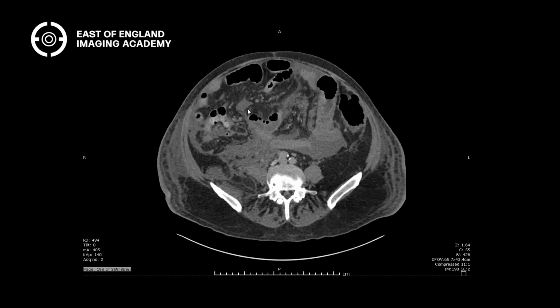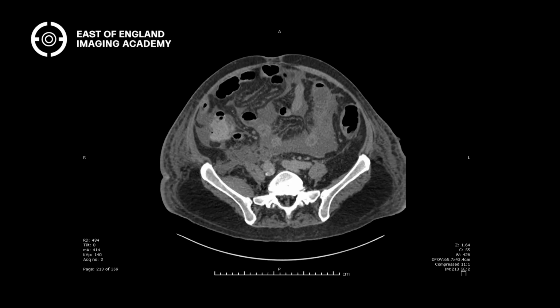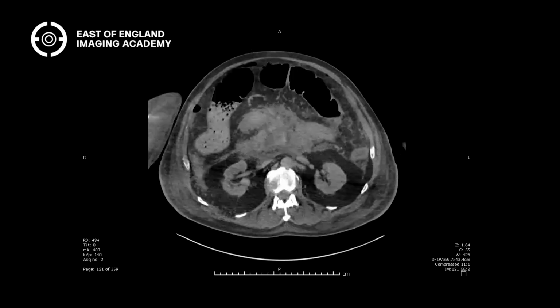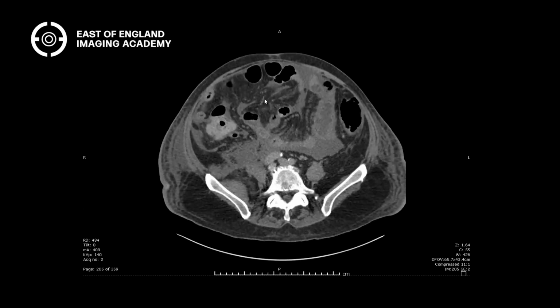It's just fluid that's not in your intravascular space. It's not in your intracellular space. It's just floating within your abdomen, right? And these patients often have multiple CT scans as follow up and things like that. And you can see that it's all gone horribly wrong. And again, you're looking for complications, right? So, what complications are we looking for?